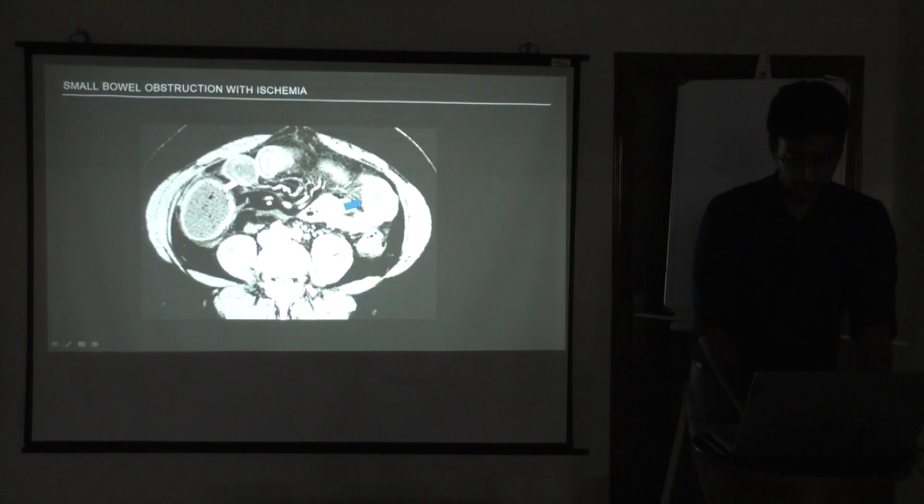First of all, feces sign is there, so there is an obstruction. So next thing is we have to find if the bowel wall is alive or dead. How do you find? There will be typical submucosal edema, like I said. Here the different walls are enhanced. Here you see the air within the lumen of the bowel. This is the mucosa which is still enhancing well. This is submucosal edema, gross edema, and this is muscularis propria, well enhanced. So that's how you are getting the double donut sign.